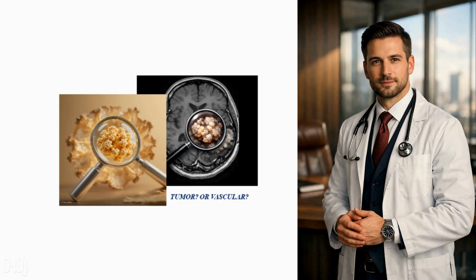50-year-old male. History of migraines, new onset seizure. The imaging reveals a well-defined lesion in the right frontal lobe with some hazy enhancements. The emergency doctor says, brain tumor.